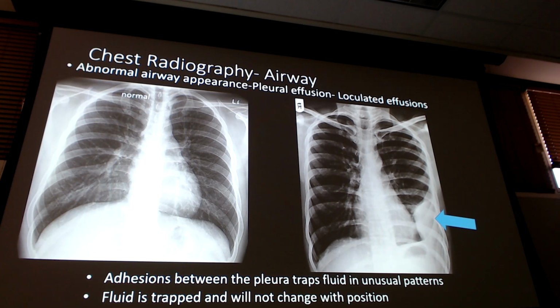Are they always going to show up laterally, or can they show up anywhere? Usually laterally, because that's where your pleural space is. Right? So it shouldn't be showing up kind of in here, because these are pleural effusions and your pleural space outlines. I mean, it can come on the inside, right? But it's almost always lateral. It's just that I got the heart and stuff in there, so it's really hard for it to do that on its own. All the ones I've seen have always been lateral.